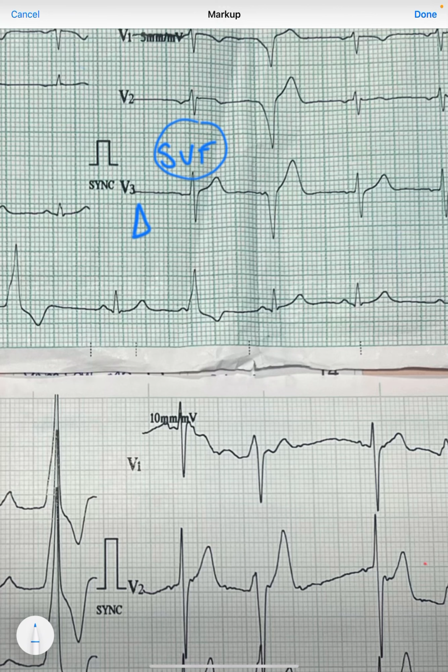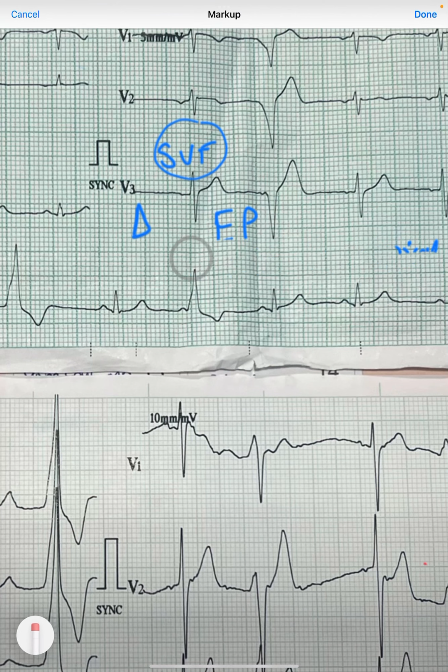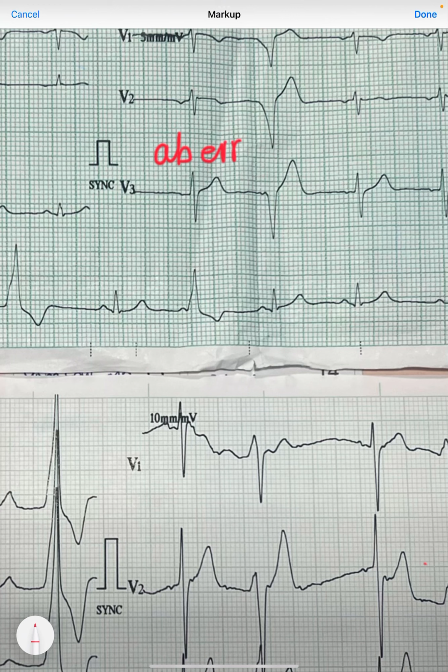What I want to tell is, if you want to diagnose it clearly, ECG definitely tells you that this is WPW. The next investigation of choice is EP study, that is electrophysiological studies, which will actually diagnose the WPW syndrome abnormal pathway. What is WPW? The normal heart conduction pathway is also associated with an aberrant or abnormal pathway, which is present usually along the normal pathway.